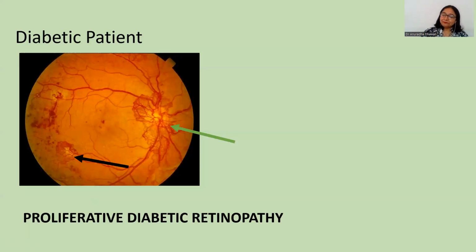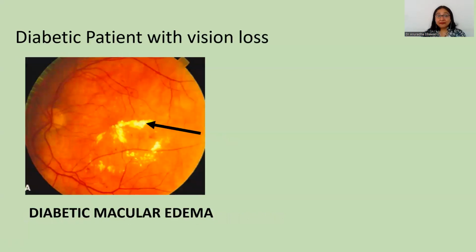No doubt. Moving on to another case scenario, another fundus image in a diabetic patient. Now, how is it different from the previous one? Number one, you can notice very carefully here that there are no new vessels.